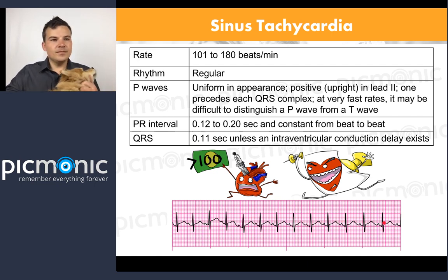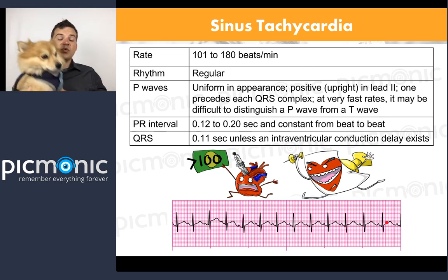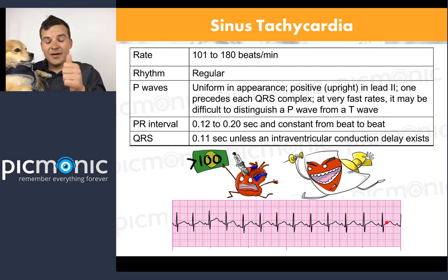13, right? 13, 130. The rate's about 130. Beautiful. Now let's look at the rhythm. You've got to have really tiny thumbs for this one. And I don't have tiny thumbs. I have big, beautiful thumbs.